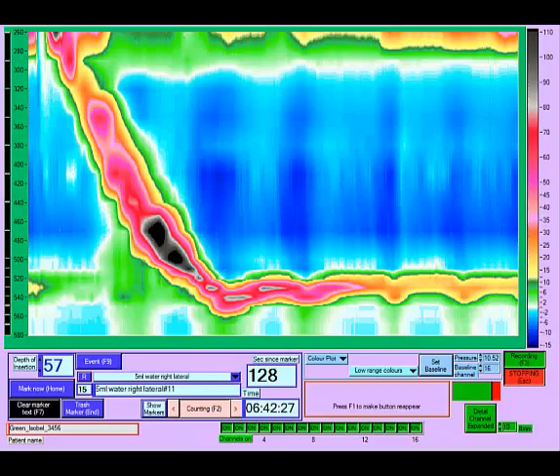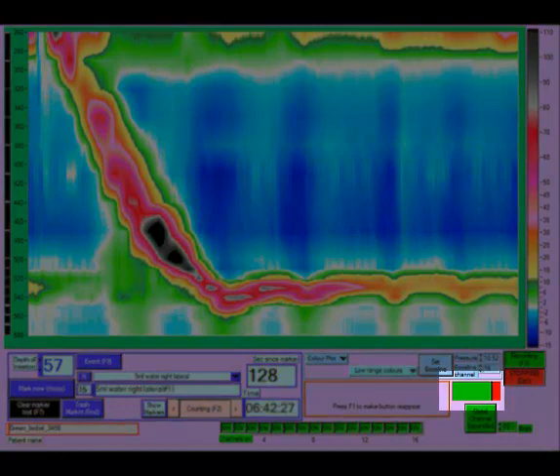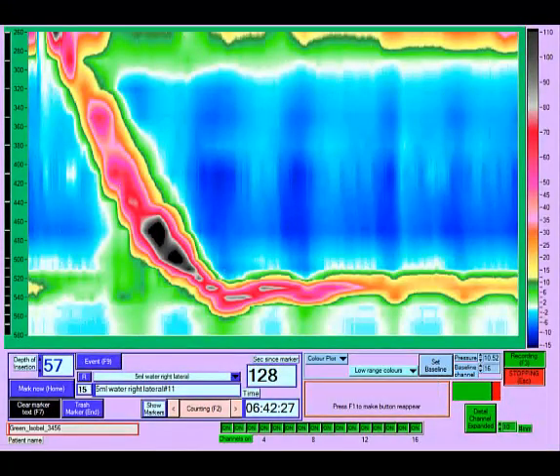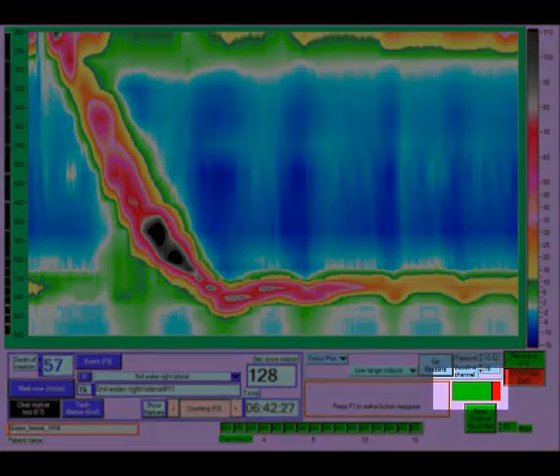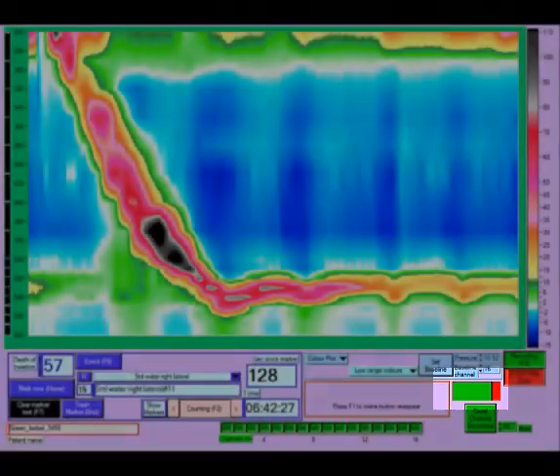Data is saved in 30-second periods. The red and green display in the bottom right-hand corner indicates the current position within each 30-second data period. If you click on Press to Stop, the button will change to Stopping, but recording will continue to the end of the current period, then cease, and you'll be returned to the main menu screen.